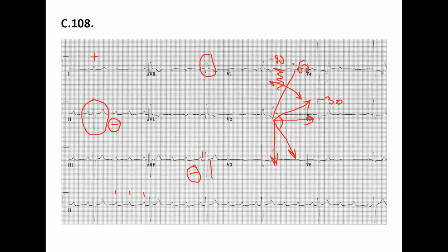And what does it mean when we do have an extreme left deviation? Now we know it. Left anterior hemiblock. See, that's a hemiblock. Immediately you can judge what this extreme left deviation means because the QRS is narrow, all right? This looks narrow, and we have this kind of problem.